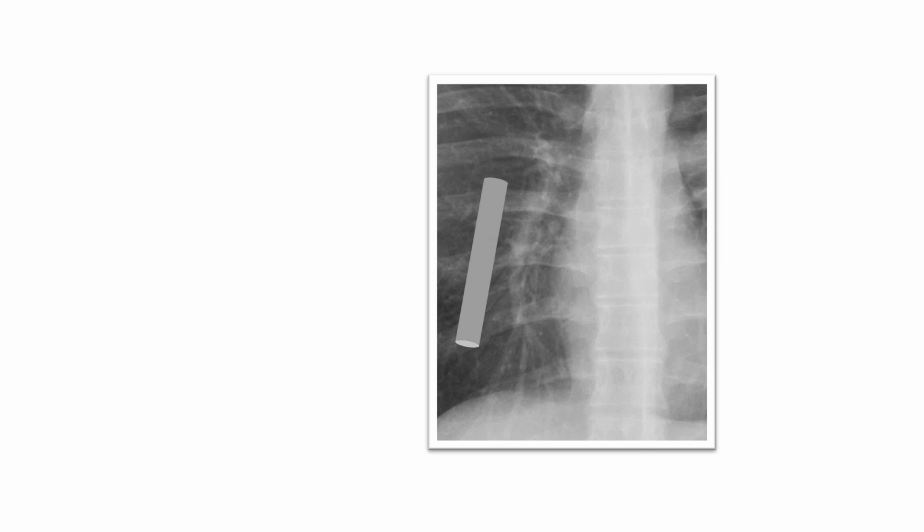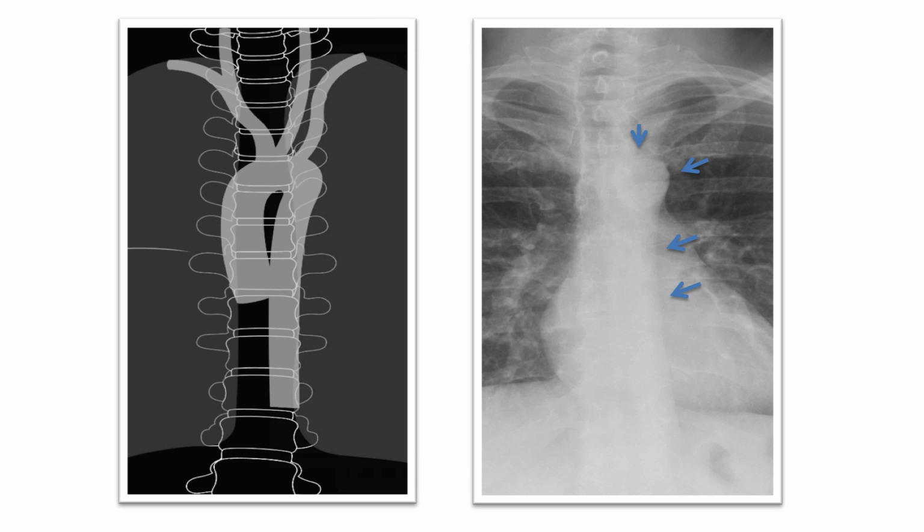On this X-ray examination, adjacent to the right heart border, we see vertical white rectangles, which represent branches of the right pulmonary artery. Because the aorta arches, we can predict that its shape will be that of a white arch or white candy cane. Note that even though we do not see the medial border of the aorta, we can still perceive its shape.